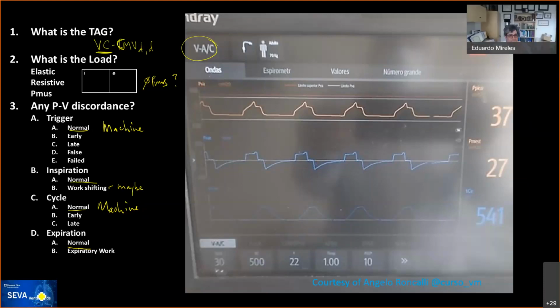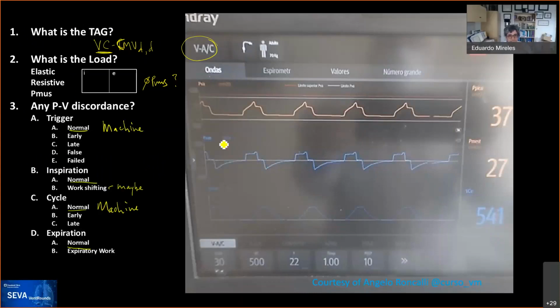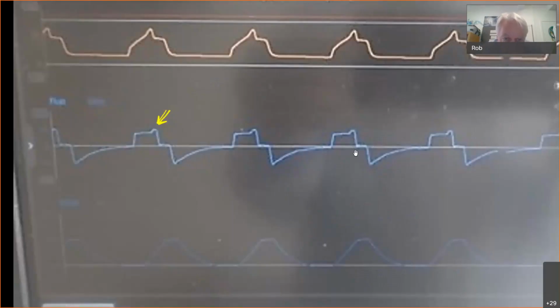And then, as pointed out, there's that little bump at the end. So we have a constant flow, and you get a slight increase in flow just before the inspiratory hold. And you can imagine, if you look straight up, you get a slight depression in the pressure waveform. That would indicate to me that this probably is some form of dual targeting, because otherwise it would have to be a preset waveform that looked squirrely like that, and I've never heard of such a thing.